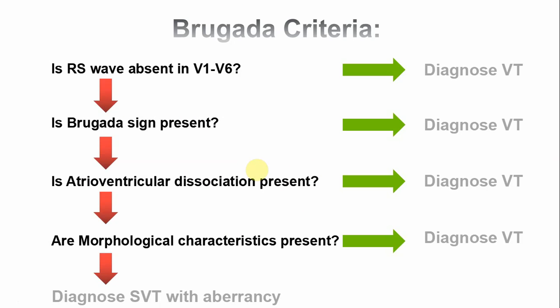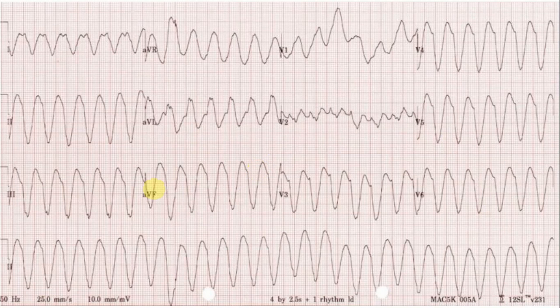All right. Now, it's time to have a look at the 12 lead ECG, and who best is there to read the ECG in a systematic way other than Becky. Becky, could you please help? This is an amazing ECG, Avijit. Thank you. I am going to interpret this ECG in a very systematic way.